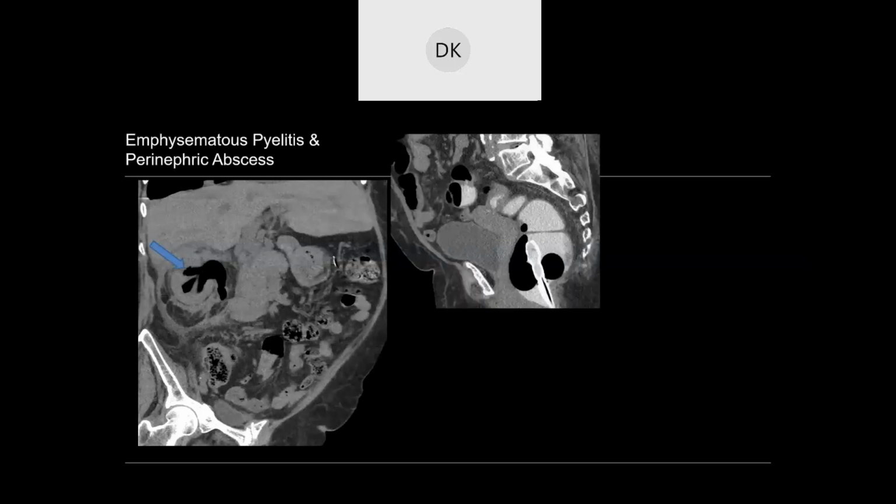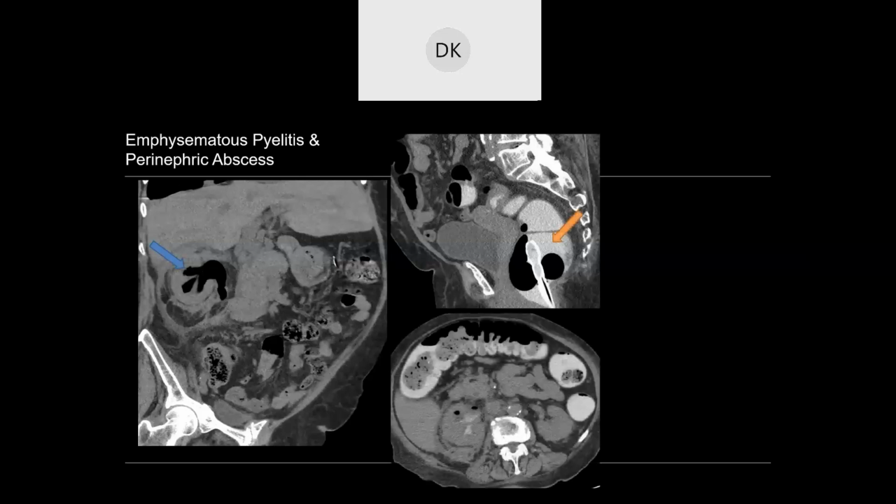And we didn't stop there. The patient then had a CT with rectal contrast. You can see here's the catheter. And that contrast ended up in the right collecting system, which is never a normal communication. There's also some gas there. We can see those black areas in the non-dependent collecting system. So this turned out to be emphysematous pyelitis due to a colоureteric fistula, an abnormal communication between the colon and the ureter. So that would need to be repaired surgically.